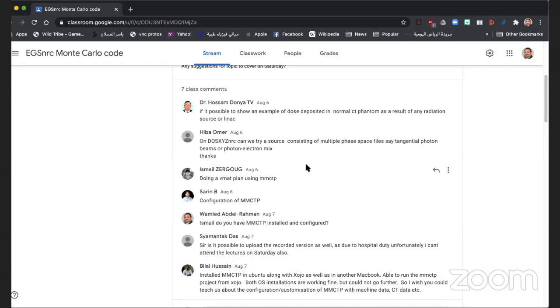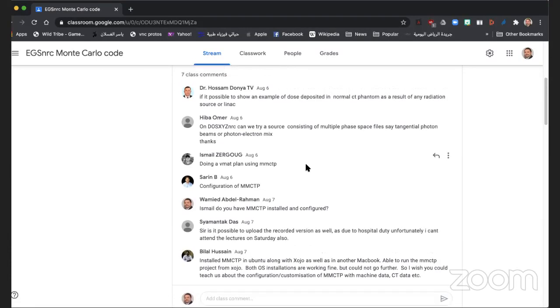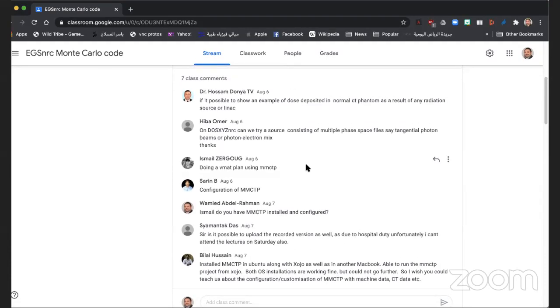And you can adjust the density of the lung, so you can make it linearly increase within this range. And then from -300 up to a certain value, you can make it fat or tissue and so on. So that is the basic idea behind generating a CT phantom using CT create.